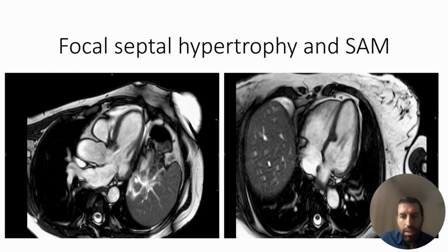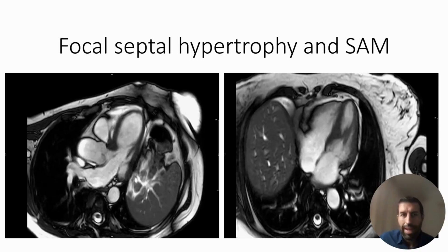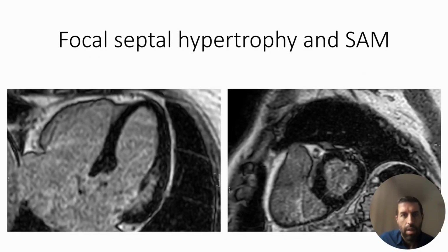Let's go back to our focal septal hypertrophy with SAM and go a step further with the post-gadolinium imaging. And in this case, we can see that there's no late gadolinium enhancement.